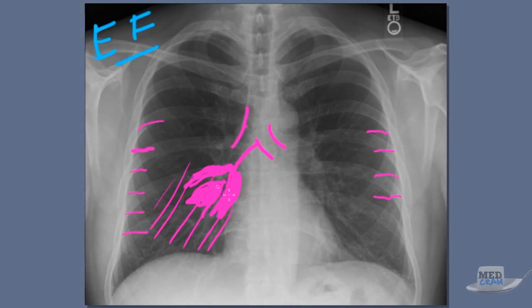That tells you that there is infection or pneumonia or water density in the lungs, but not in the airways. And that's important to know because when you see an air bronchogram, that tells you that air is actually getting to that area, that it's not an obstruction.